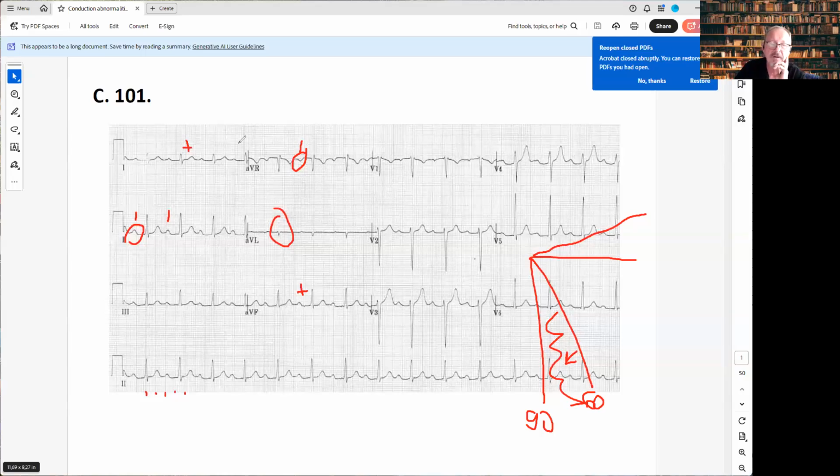We have to decide whether this is a sinus rhythm or not. Okay, lead number 2, the P wave is positive and negative in AVR, and the same kind of P wave is coming regularly. So this is a sinus rhythm. We said that is a regular one, period. Rate is around 80, 90, period. Axis was between 60 and 90, good. So that's a sinus rhythm.